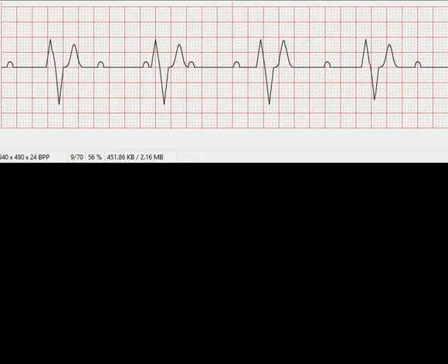So if you look at this, again it's the computer program working on this, but it would not be these triangular points like this. It would be more of a sine wave, but nonetheless, the QRSs here are not narrow. These are wide QRSs. They're basically 5 blocks wide. If you look at this one, this is pretty clean. This starts before the line and ends pretty much right on the line. So it's like 5.5 blocks wide QRSs. That's a wide QRS. So we start thinking ventricular right away.